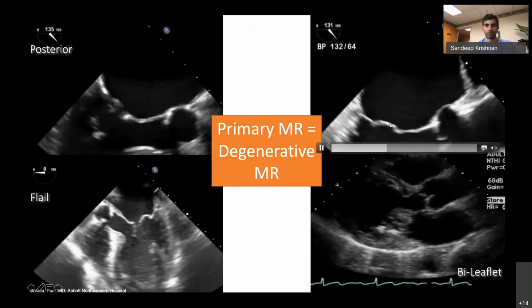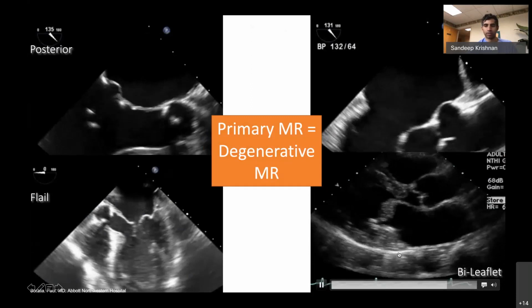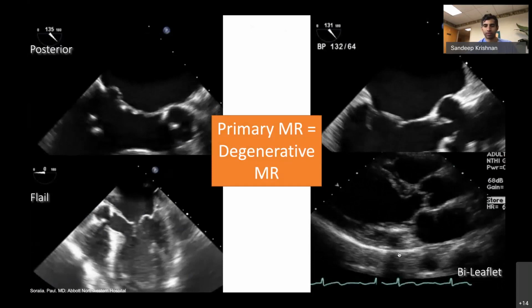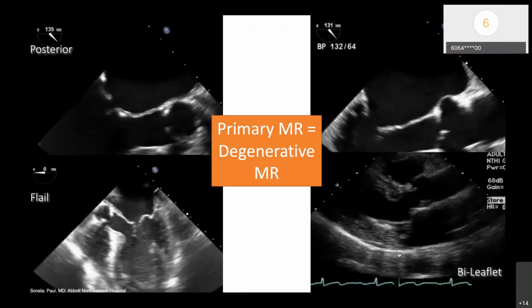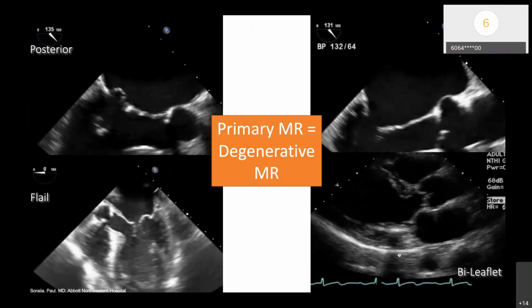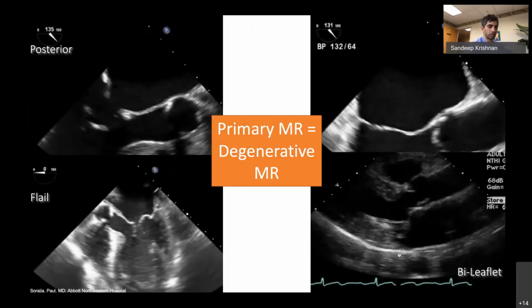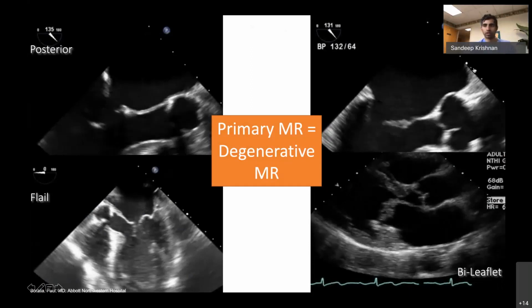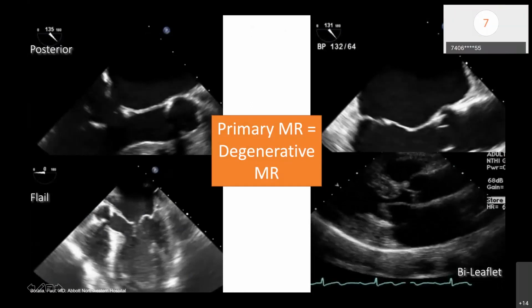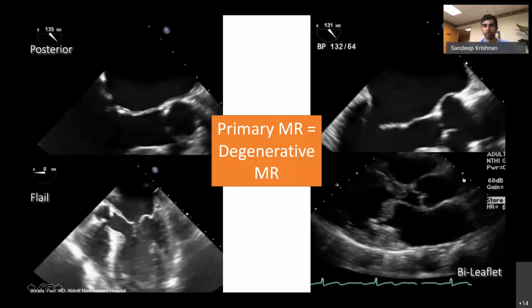What about on the bottom here? This is a transthoracic on the bottom right. If you're on the phone, just yell it out if you can. Bottom right. Or if you're not in that room, just unmute yourself. Make sure you unmute yourself if you're trying to talk. Prolapse of anterior? Yeah. No. Yeah. Oh, okay.